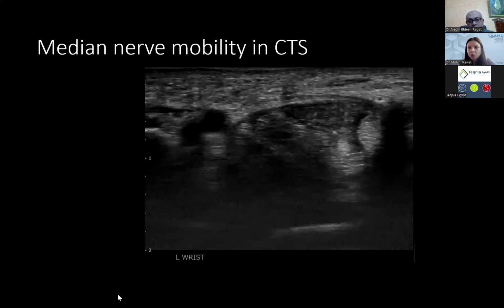The more you lose that honeycomb or fascicular texture, it suggests axonal injury. But if you just see endoneurial edema, showing swelling and more engorgement, that coincides more with demyelination or vascular congestion in the beginning. These are some of the features you can use to inform how severe this looks sonographically. And then there are also some gray areas.